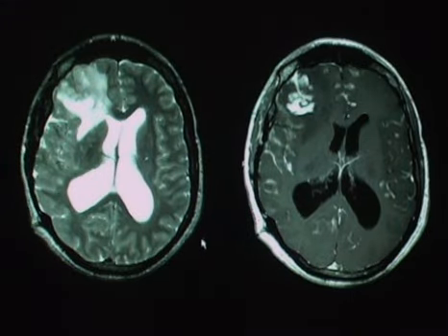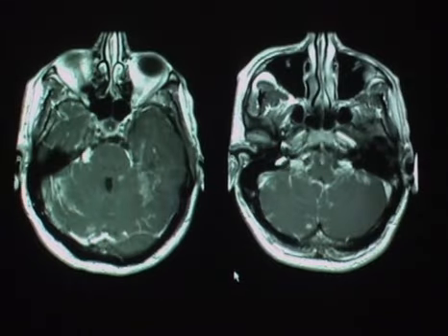Here's a more prominent case, and what we see here is extensive enhancement within multiple cerebral sulci. We have moderate enlargement of the ventricles compatible with the hydrocephalus, and we see a predominantly cortically located focus of lobulated enhancement with its associated edema, all findings that we can see with the tuberculous meningoencephalitis. Here are some additional images demonstrating the basal predilection for meningeal disease related to tuberculosis. We see abnormal enhancement basically filling these cisterns, and we see also coating of the trigeminal nerves here. We see extensive abnormal enhancement along multiple foci, both the cerebrum and cerebellum.